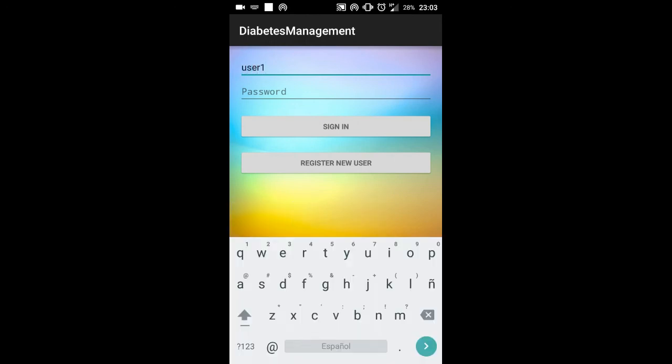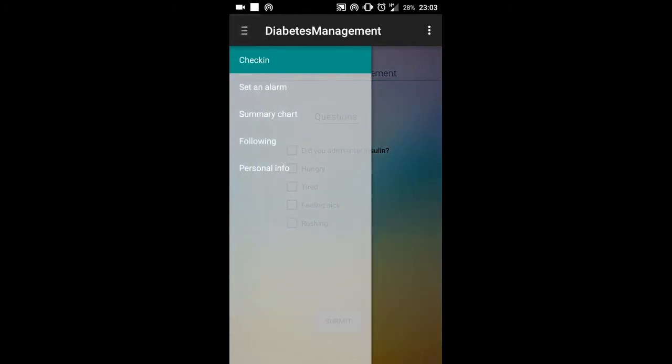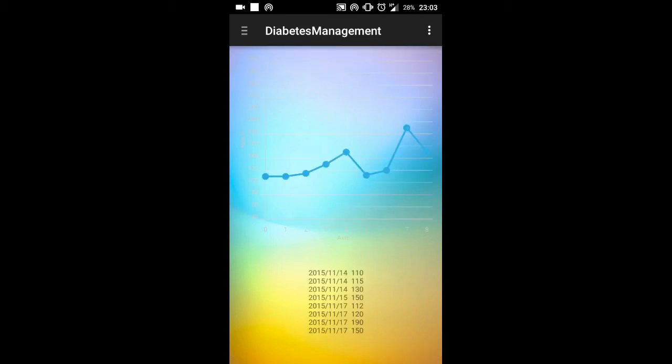So here we are again. Right now, as user, we have user1 that we can follow and check all the information.